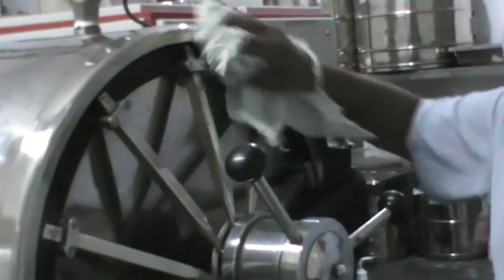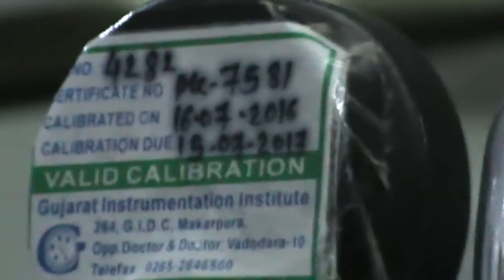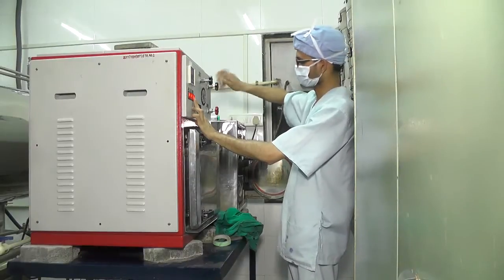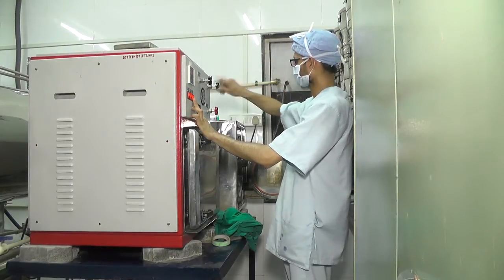The outside of autoclaves should be cleaned daily while the inside surface is cleaned weekly. The inside cleaning needs the use of trisodium phosphate to remove chemical residue. Regular servicing of the autoclave machines at 6 monthly intervals is mandatory. Calibration of gauges should be done at regular intervals, once a year. Validation of the autoclave machine also needs to be done at yearly intervals.